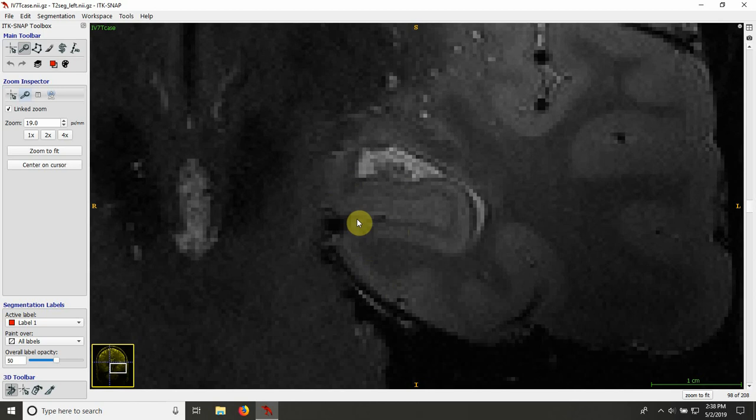The way I would draw the border, and this I would normally do in my mind, but to point it out, I would outline the gray matter here and pick the most medial point here, and that would be my border between the subiculum subfield and the entorhinal cortex. The subiculum is one of the subfields of the hippocampus. This is one of the borders that differs between segmentation protocols. I generally pick this border because it's easily identifiable and I can very consistently find it in different subjects. But I'm not necessarily arguing that this is anatomically the best border.